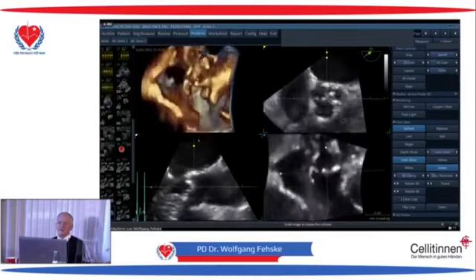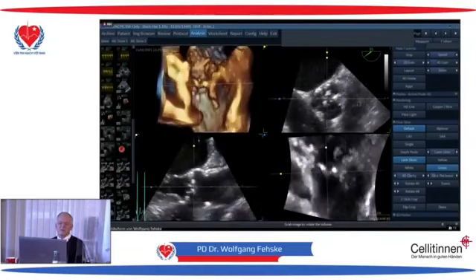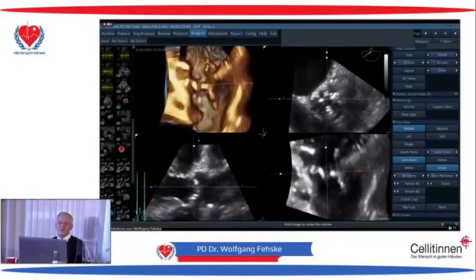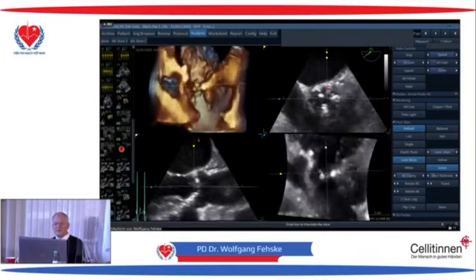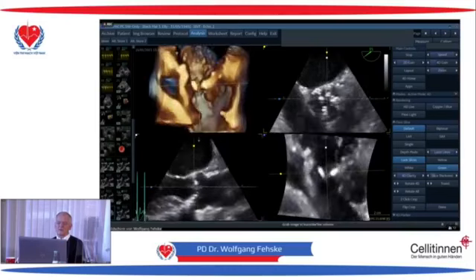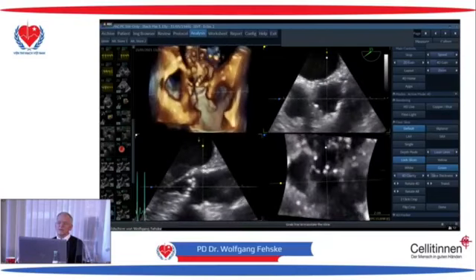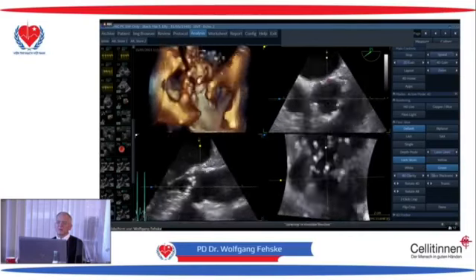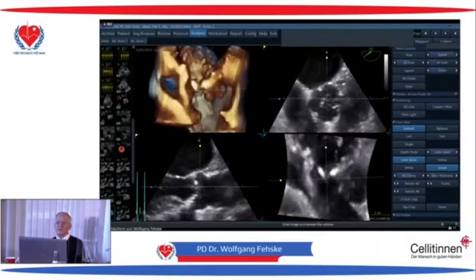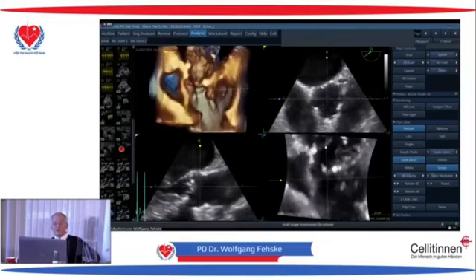In this case, it is really not so severe. You see it, but we describe it exactly what we see. And the anterior mitral ring is free of calcium in this case. Is that your question? And I describe exactly where we see the calcium, and we describe, of course, the distance from the valve to the coronary arteries for TAVIs, not for surgical.